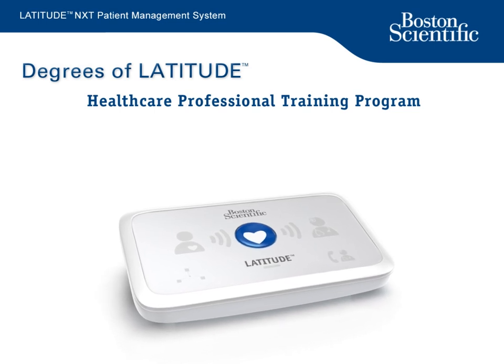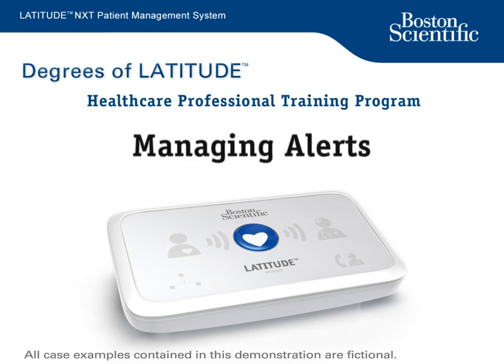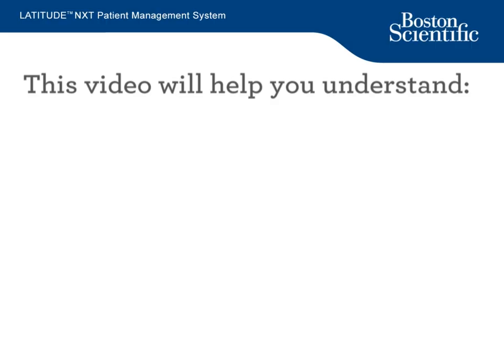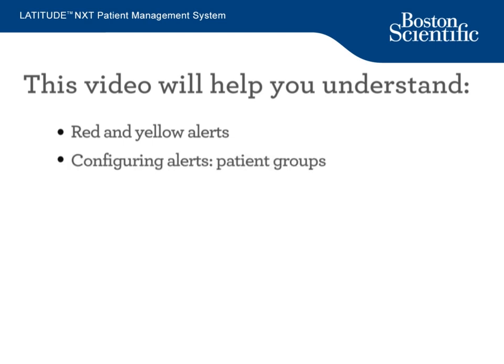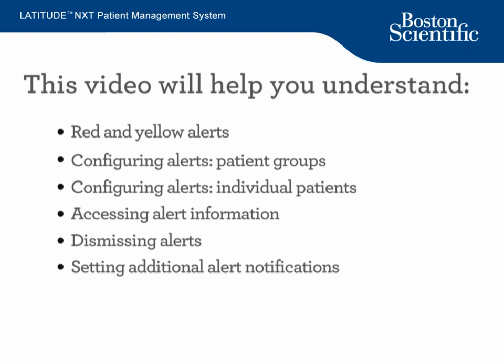The Latitude NXT website offers you flexibility and control over how you receive, review, and manage Boston Scientific device and patient data. In this training module, you will learn how to manage alerts in Latitude NXT. After viewing this video, you will better understand red and yellow alerts in Latitude NXT, configuring alerts at the patient group level, configuring alerts for individual patients, accessing more detailed alert information, dismissing alerts, and setting additional alert notifications.